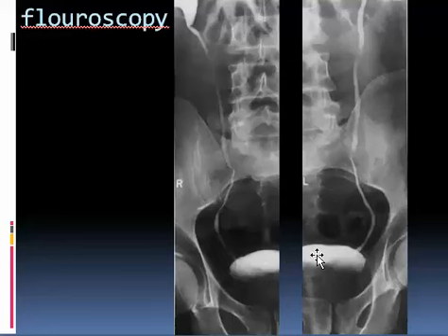It's not a diverticulum, it's just sagging backward, because here the wall is thickened more than the wall at this region. So the interureteric ridge is a line joining the insertions of the ureters, separating the vault of the bladder and the base of the bladder.